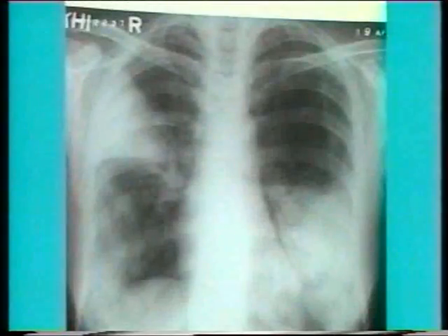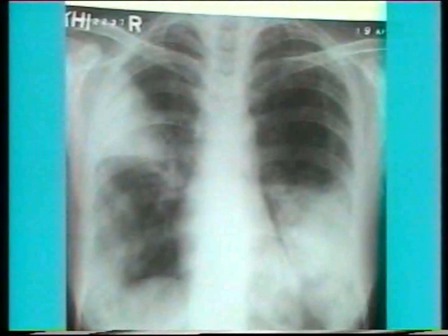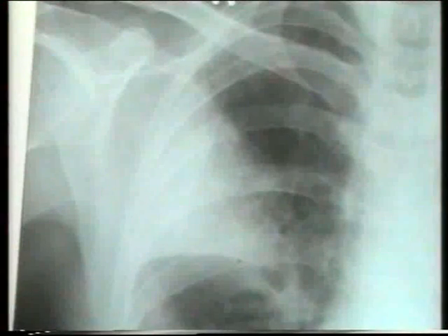This X-ray shows consolidation at two places. Firstly, in the right upper lobe, affecting the apico-anterior segment, and in the left lower lobe. In close-up view, note the uniform opacity characteristic of consolidation and the sharp delineation of the apico-anterior segment lined by the transverse fissure below.